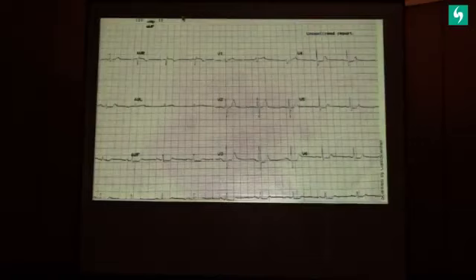Okay, now this is a young 32 years old man. Now, this patient came to me in the OPD, and he had come to the emergency room a day prior and was sent home because his first card test was negative, and there was this ECG which was sent as unremarkable. His pain was not so typical.